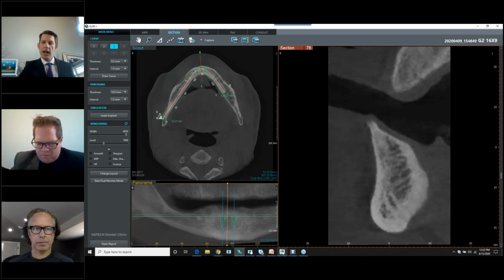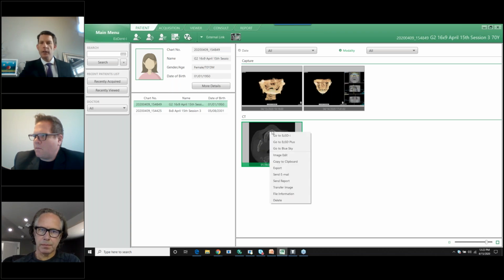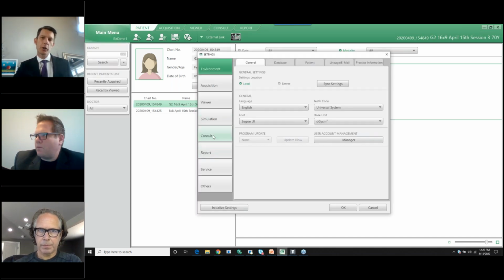One last question I get a lot is, can I export this? You know, Blue Sky Bio is really popular. You can see on here what I've done is I can right click on my icon here, and we've been just double clicking and opening Ez3D-i. You have various softwares where you can load that into, and I've created this go to Blue Sky Bio link. So when I actually click on that, it directly opens into Blue Sky Bio. I'll show you really quick, but we do have a video that runs through that on our website. Again, that's going to be vatechamerica.com, going to the customer learning center there.